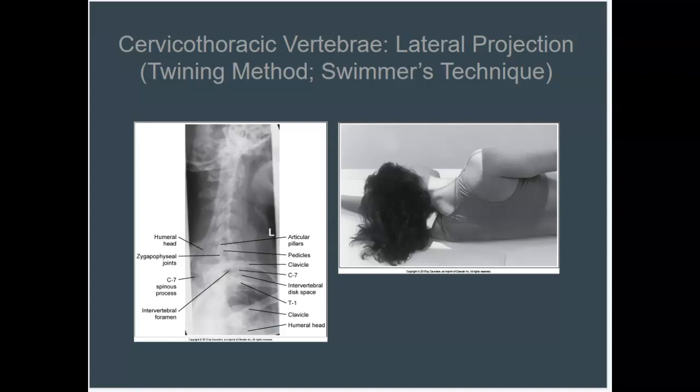I know there might be a little variation with that, and again, Merrill's does not go into this much detail, but these are some additional guidelines for you to utilize to understand whether or not you have enough anatomy on your image, as well as some guidelines that are a little bit more in depth.